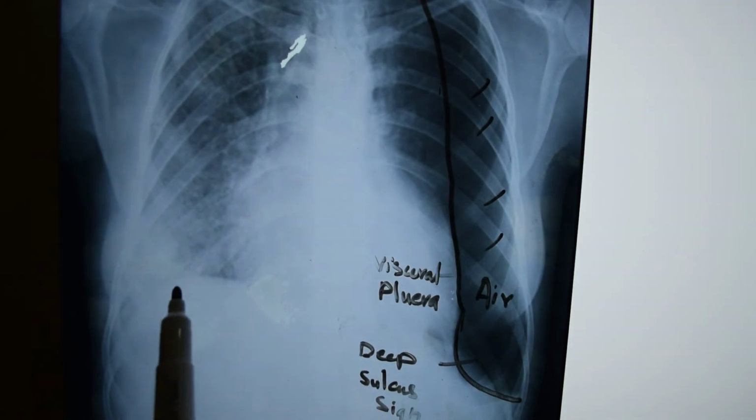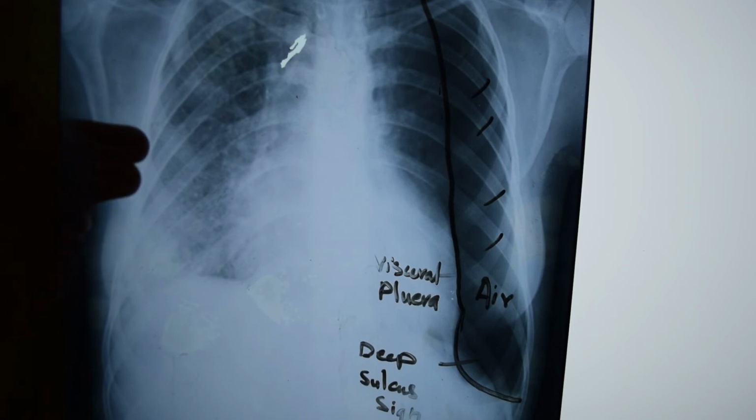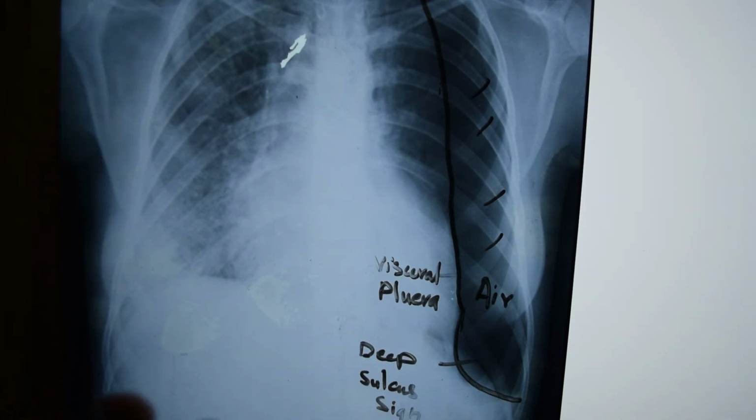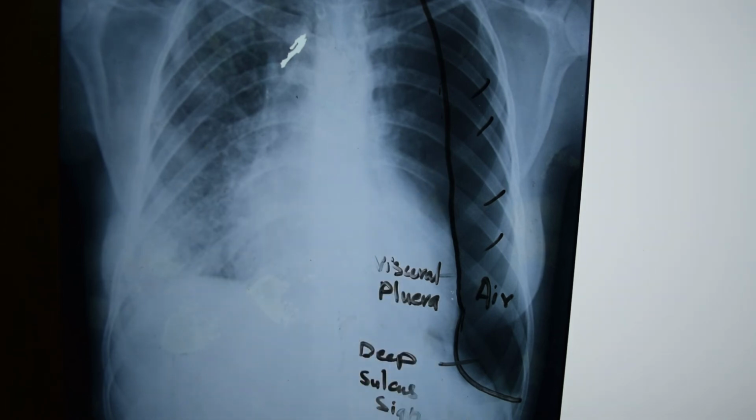On the right side, this is the diaphragm. However, this is blunting of this costophrenic angle. There might be some effusion here, as in this case my patient is a known case of CKD. So the patient may be in overload, and there are fluffy infiltrates over the right lung, and the patient is on regular dialysis. So this is a bit dirty parenchyma, and the patient unfortunately developed this pneumothorax. However, there is no mediastinal shift towards the opposite side, so this is not a tension pneumothorax. Basically, this is a secondary spontaneous pneumothorax.